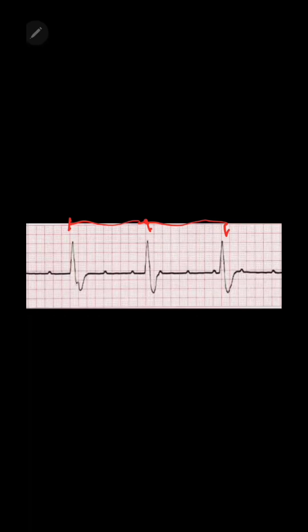And just like before, you have a buried P wave right there, that's why this T wave looks different than the others. Every P to P interval also remains constant. However, all of your PR intervals will randomly change.